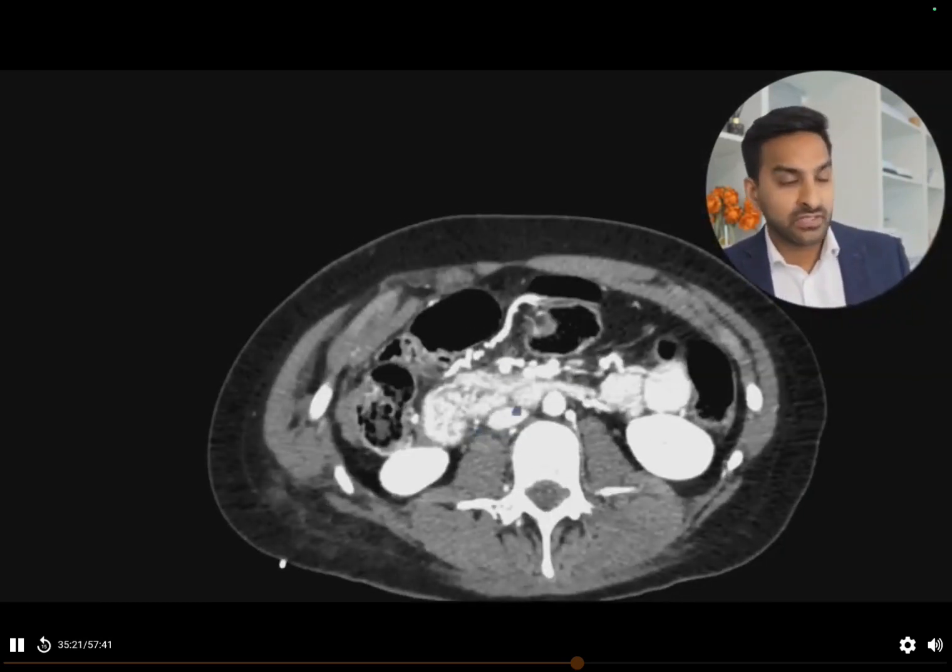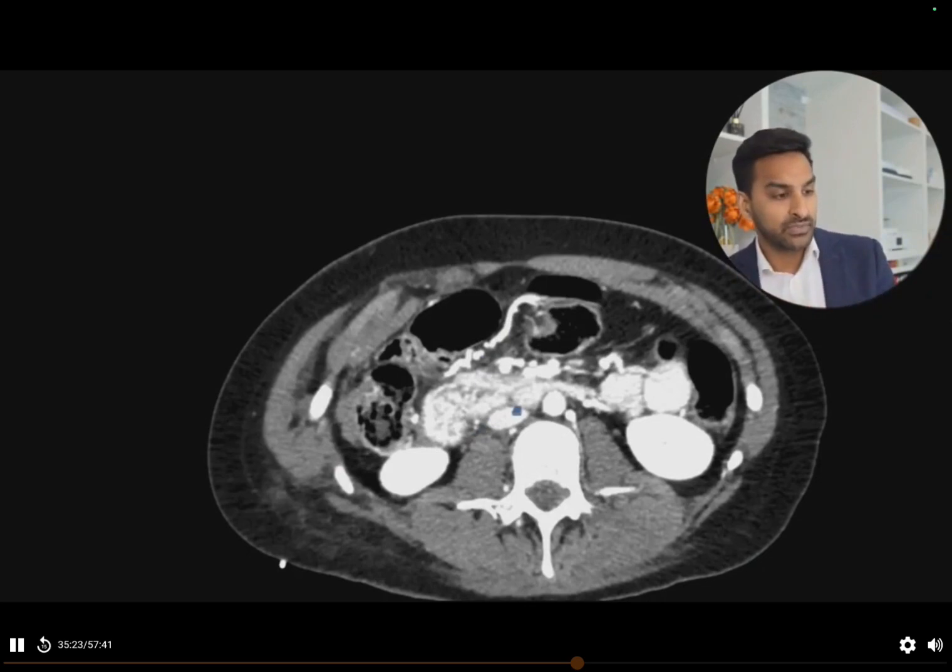So what it looks like, we've got a few findings here that has happened with this person. This person has had a significant hepatic injury with a subcapsular hematoma, and we've got some intra-abdominal free fluid and potential hematoma. We've got some ischemic bowel, which looks like a small bowel, particularly within the region of the pelvis. We have got a perforation of what appears to be the cecal pole and some herniation of intra-abdominal contents through a defect in the right abdominal wall.